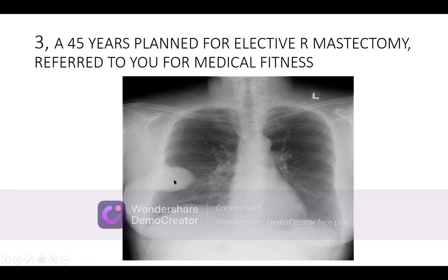So it is a differential diagnosis. It is an acute inflammation or the result of an acute inflammation. It may be a pulmonary abscess. Chances are less. And it may be chronic inflammation, that is called tuberculosis, a cavity is possible, but least likely. The fungi can cause this type of problem as well, but least likely.